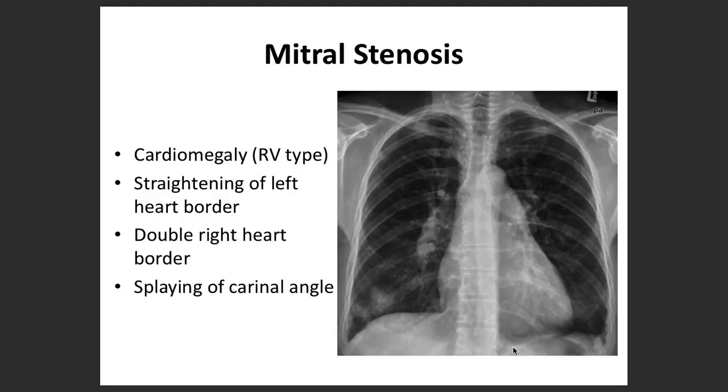Now, a very favorite X-ray, especially in medical examinations, is mitral stenosis. So, mitral stenosis, what do you see? There is, of course, cardiomegaly, but of the RV type.